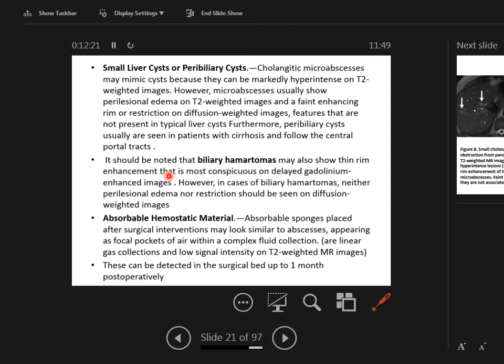Exactly. And the abscess on diffusion study. But for example, in the previous case, the focus of calcification helped us determine exactly that this is a tumor, it's not an abscess. But if there is no focus of calcification, it would be very difficult. Maybe you have other clinical criteria, for example white blood cell count, which would help in moving us toward the actual abscess. So you have a clinical approach. You need all the clinical data, not only the imaging data.